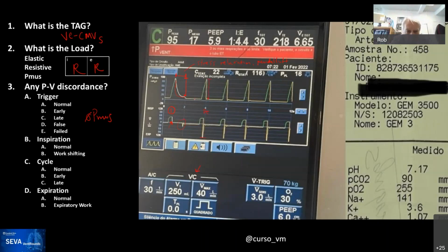So you have to ask yourself, what is the driving pressure that causes the peak expiratory flow? If you have a plateau, an inspiratory hold, it's the plateau pressure minus the end expiratory pressure, not total PEEP, but the airway pressure. That's your driving pressure. And in the next breath, the pressure drops all the way from peak down to PEEP.